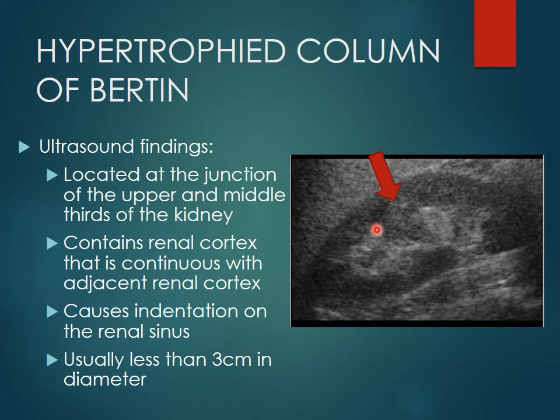It is differentiated from a mass lesion because of the presence of the renal cortex, and it may also indent the renal sinus itself.